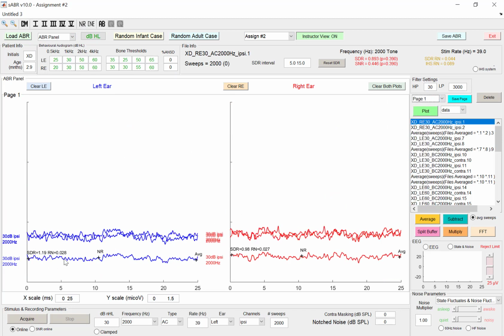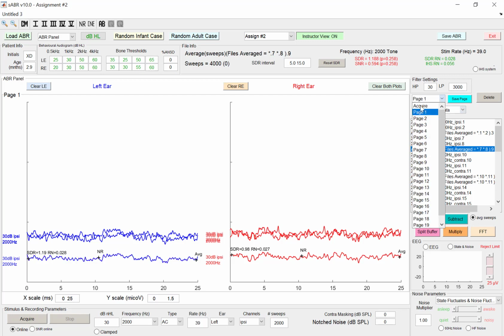The other thing that's nice about doing this is that you can select one of the files and say, I'm not too sure whether there's a response there, and click on data and signal and plot the two. The signal is in green and the overall data is in blue. You can also present that as all the data, so the noise is in purple. We can see that there's definitely no response and they've gotten that correct. So we can just go back and plot that data.